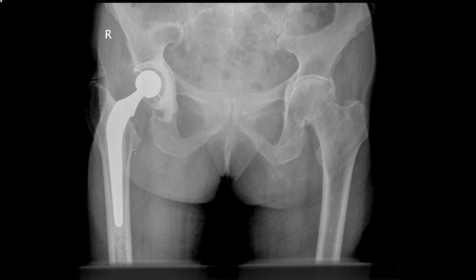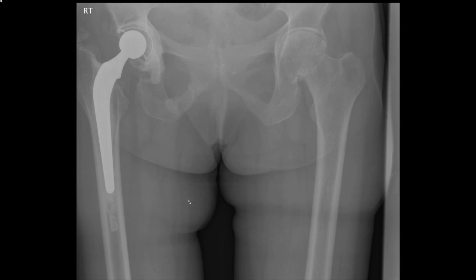1, 2. If we compare with the previous radiograph taken after her hip prosthesis was inserted, we can see that this pubic ramus is normal. There is no evidence of a fracture. That gives us increased certainty that there is truly a pubic ramus fracture. So here we are returning to the current image, and there's clearly fractures here, made more certain by the previous normal pubic ramus.